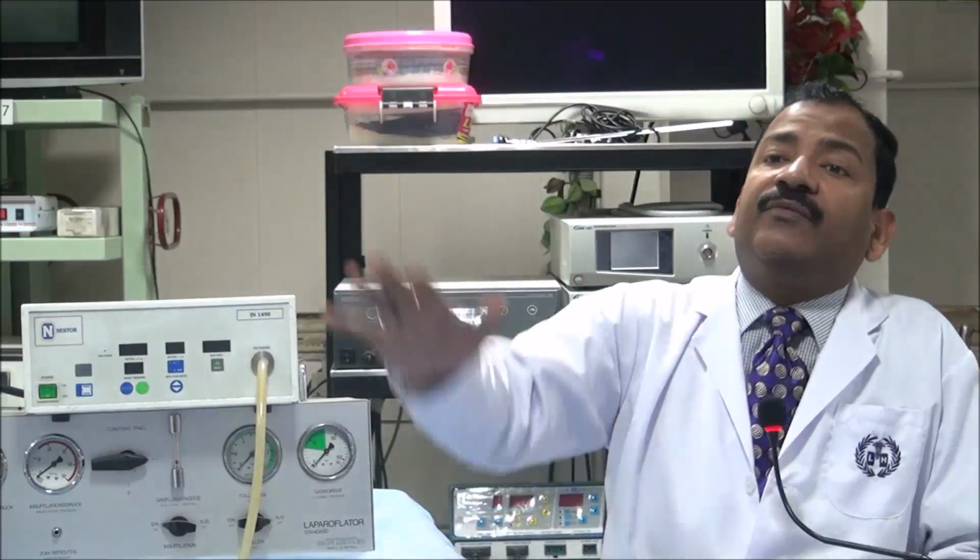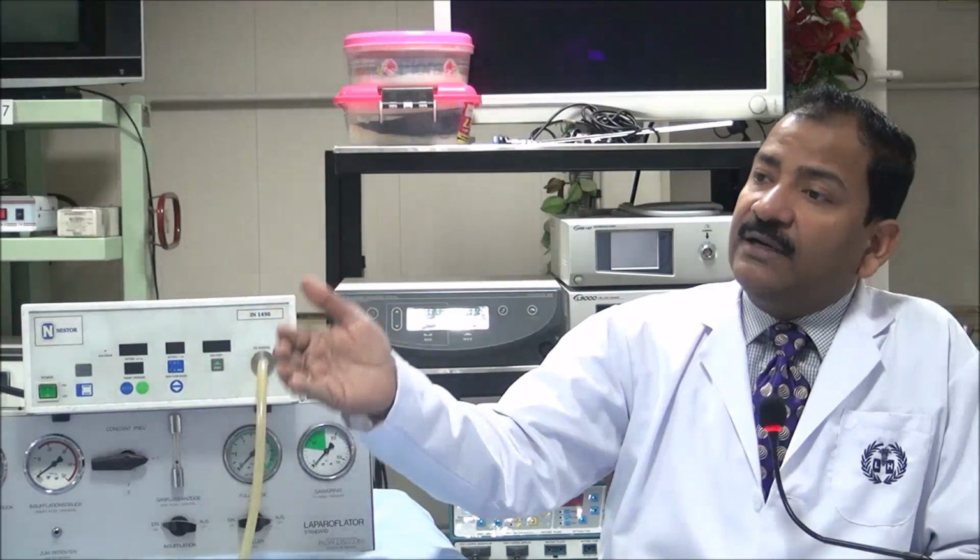Just like if you have a sports car, that doesn't mean that if you sit in that car, as soon as you start it, it will go 350 km per hour. Maximum speed is 350 km per hour. But even that car you can drive at a rate of 5 km per hour. So maximum flow rate is 45 liter. This is the first criteria when you buy the insufflator.